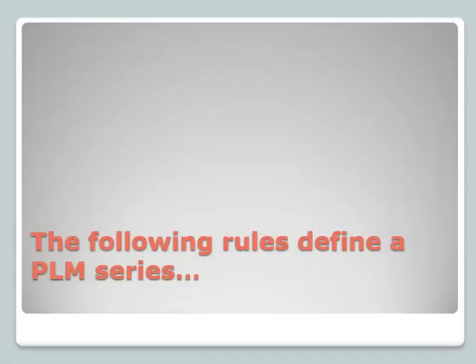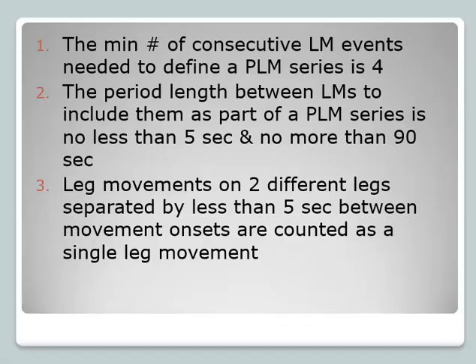And what defines a series is that you have a minimum of 4 leg kicks separated by no less than 5 seconds, but no more than 90 seconds. And if you have 2 leg kicks on 2 separate legs that are separated by less than 5 seconds, they're counted as a single leg movement. Let me say that again.